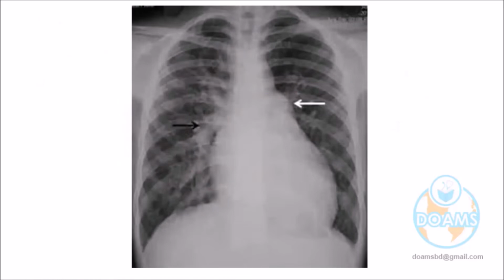This is an X-ray. Your patient is hypertensive, whatever AKT or OSCE. What are you seeing here? What is your observation? What will be your diagnostic formulation? Please, anybody respond. This X-ray is given to you in the OSCE. Left ventricular hypertrophy. Is there any cardiomegaly?